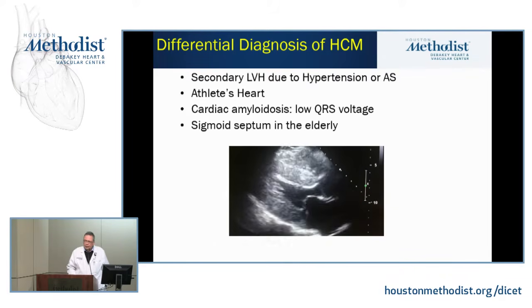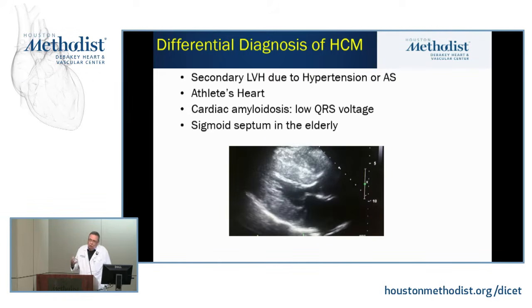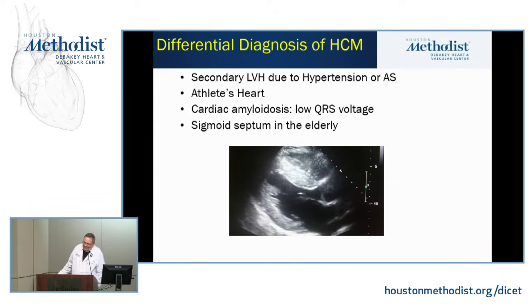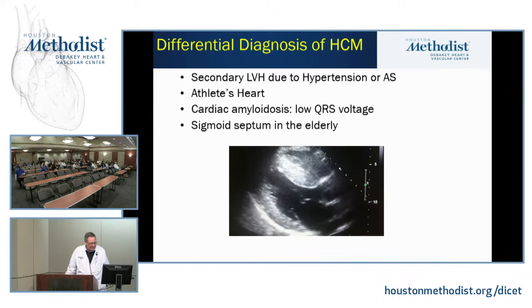What's that? Carlos, what do you think that is? What does it look like? Not what do you think it is, what does it look like? So the fact that there's hypertrophy, but EF is not that hyperdynamic points more to the amyloid.